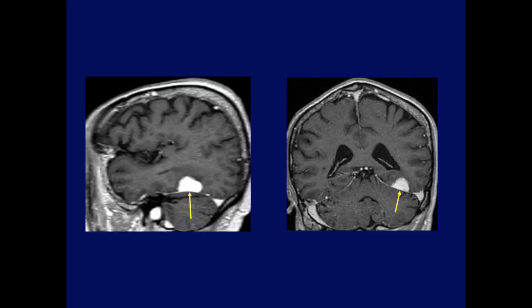Another lesion, looks like a tentorial meningioma. This was a metastatic lesion from lung. So remember the many simulators for meningiomas.